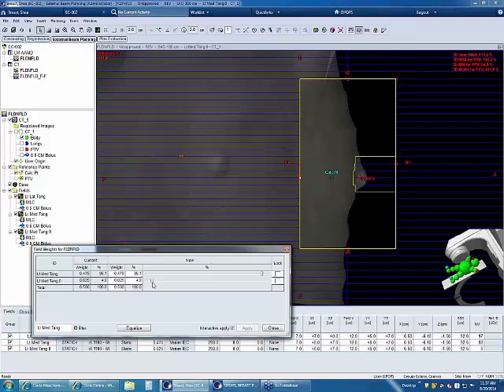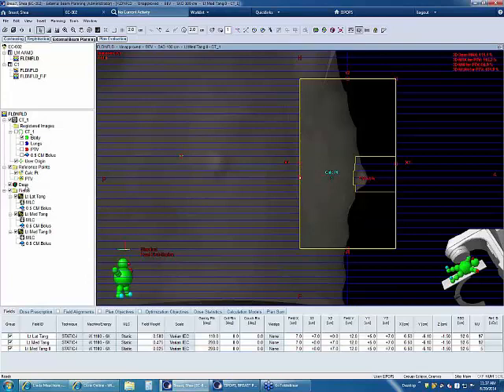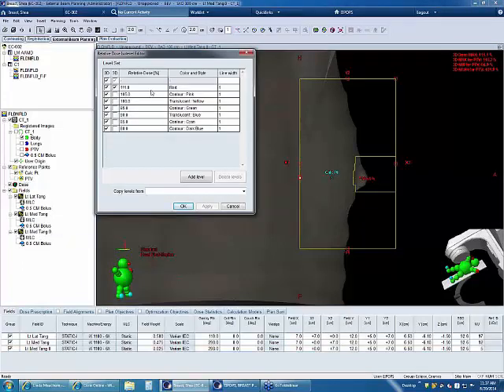Okay, good. You should have at least 5 monitor units per subfield. And I'm going to close this, and I'm going to save it. And then I'm going to go to my next isodose line. So I'll go over here to the dose, right-click, go down to isodose levels, and this one I'll choose, say 109, and say OK.